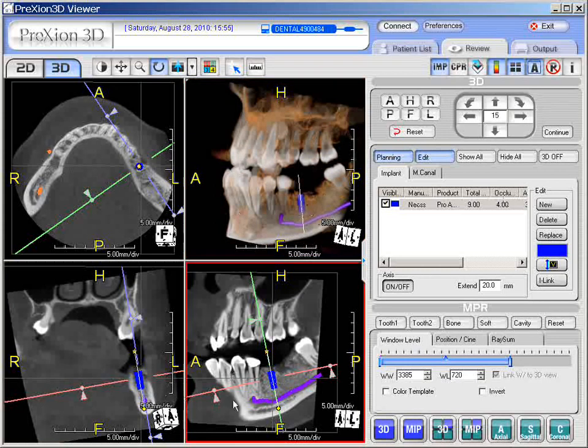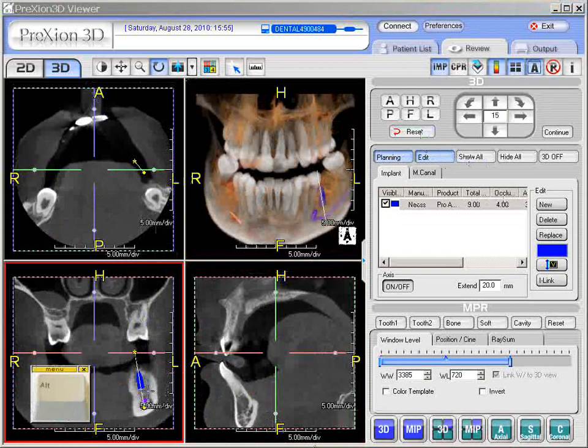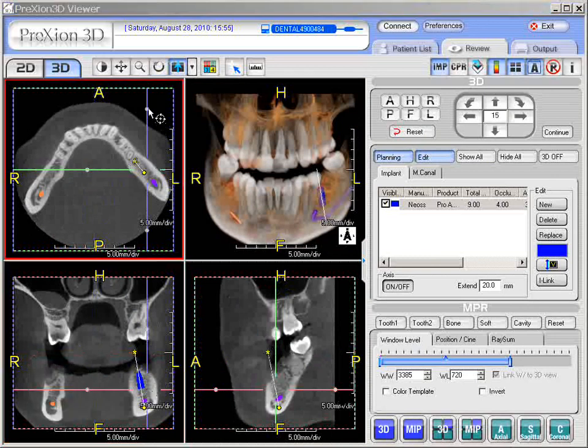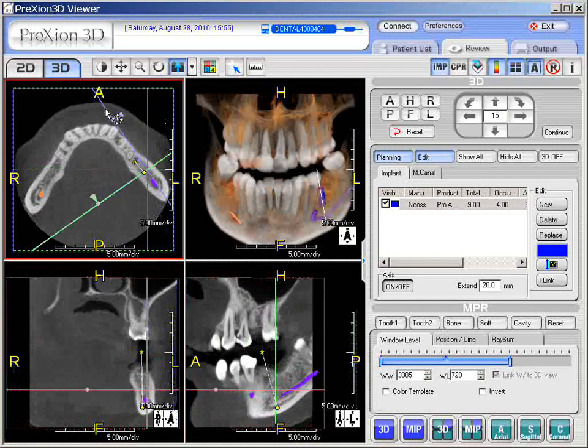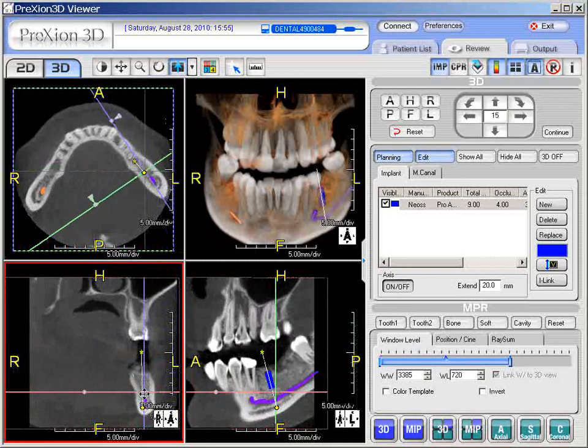the implant. Now let's say we want a second implant. All we do is we're going to go back and we'll hit reset, and we'll go back, we'll bring in the Alt key. Again, we'll click in the location or close to it. We can click here and then go grab the anchor point up into the actual screen, move it over, and this gives us an opportunity to see our next section where we wish to grab and go.